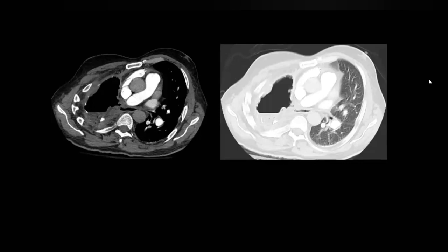In the first image, the mediastinal window, there seems to be a communication between the cavity and the esophagus. Again, there can be an iatrogenic or abnormal communication between the resected lung and the esophagus. Fistulous communication between these two areas might have caused the infection and the air fluid level. Basically, I'll be concerned about finding out the source of air which has found its way into this patient. That again, as I've mentioned earlier, could be due to infection, iatrogenic cause, or abnormal fistulous communication. These are all reasons I'm thinking upon.